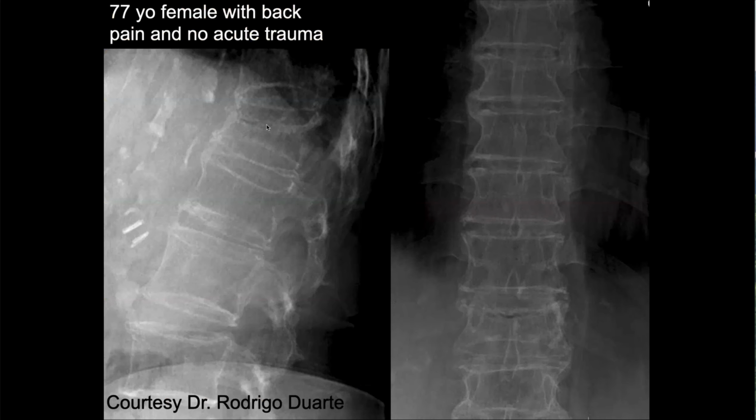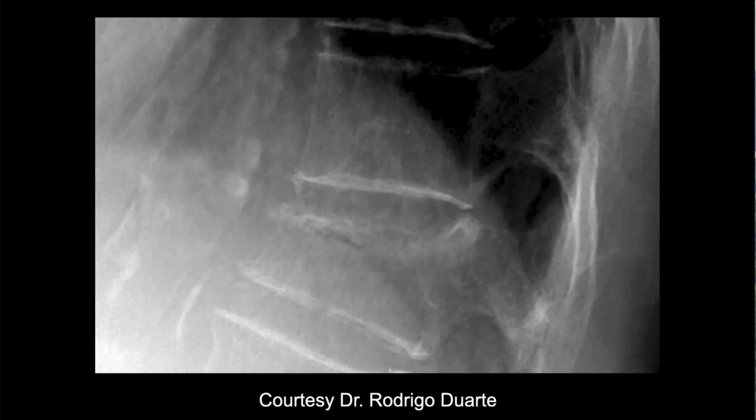Now notice that there is this low density material in here. What's going on there? Is that like air? Maybe some osteonecrosis. Well, I think this is an acute fracture. I don't think this is osteonecrosis. But this can be gas inside the fracture, and it's pretty uncommon. But when you see it, it's virtually never associated with malignancy. It's almost all associated with osteoporotic fractures.